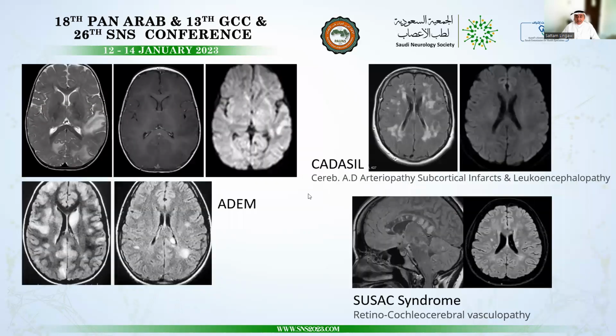Now, in comparison, there are other demyelinating processes that do not follow the same pattern of MS distribution and obviously have different clinical presentations. ADEM, often seen after vaccination or infections, gives you large, confluent, asymmetric distribution in the deep and subcortical white matter, often posterior, less likely involving the basal ganglia, and may give you subtle restricted diffusion. The pattern of enhancement is rather subtle and uncommon.